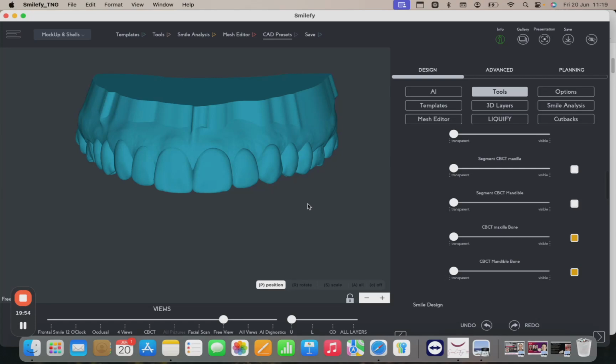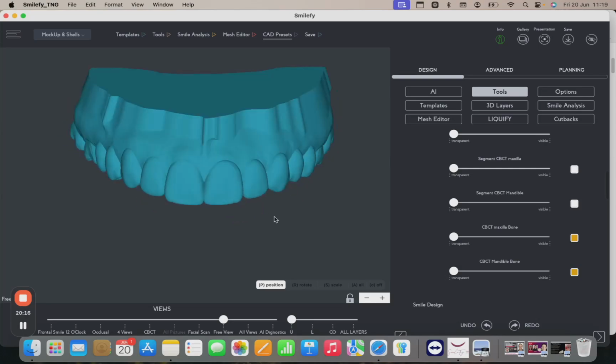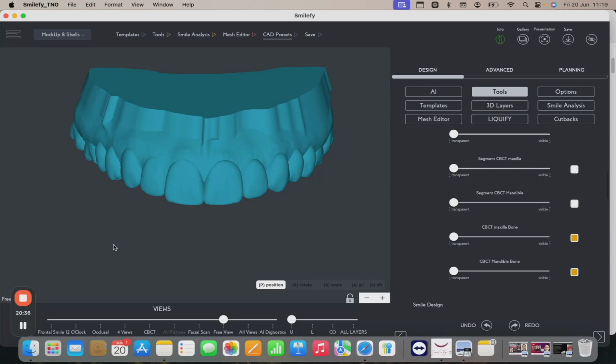So in those specific cases, I would just print the model with the design. I'd say both design types are great. You just need to use one or the other whenever it's needed. Okay? All right. Now let's move on with other types of 3D design.